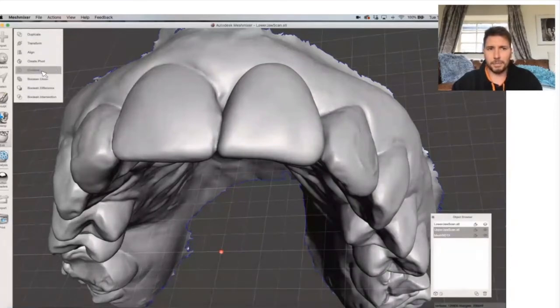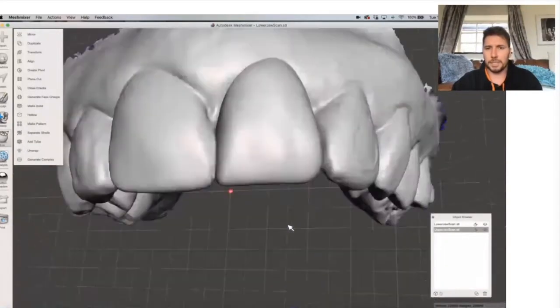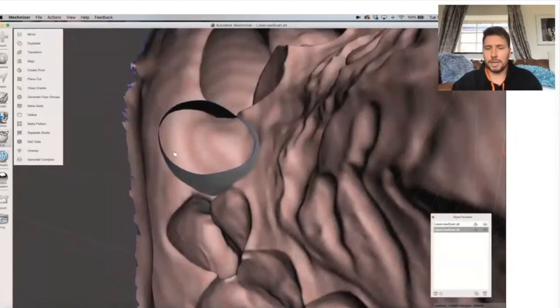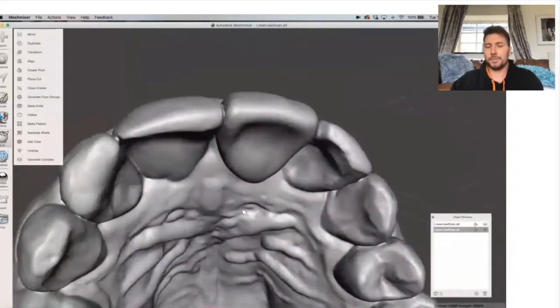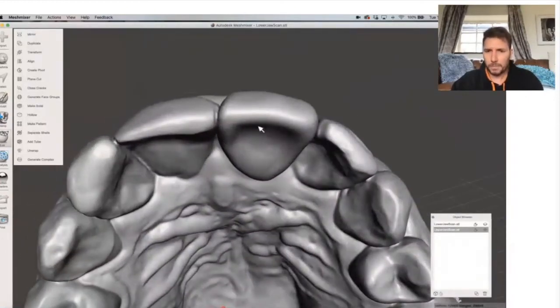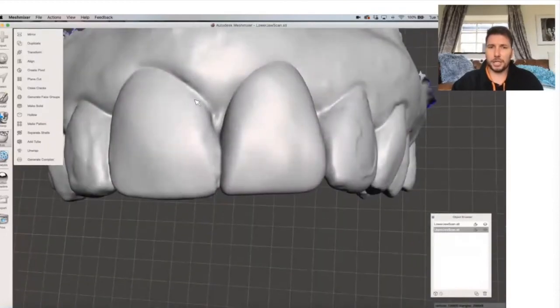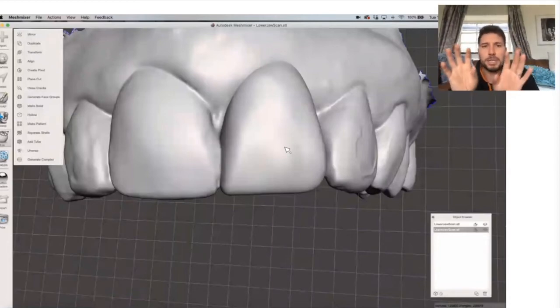If you click Combine here, what happens is it's turned on. That's just one model now. You can see it's still there. When things are joined together with the combine function, it's basically putting a magic glue to combine both of those pieces of paper shaped in the shape of teeth and joining them together to be one. But there's still two pieces of paper.